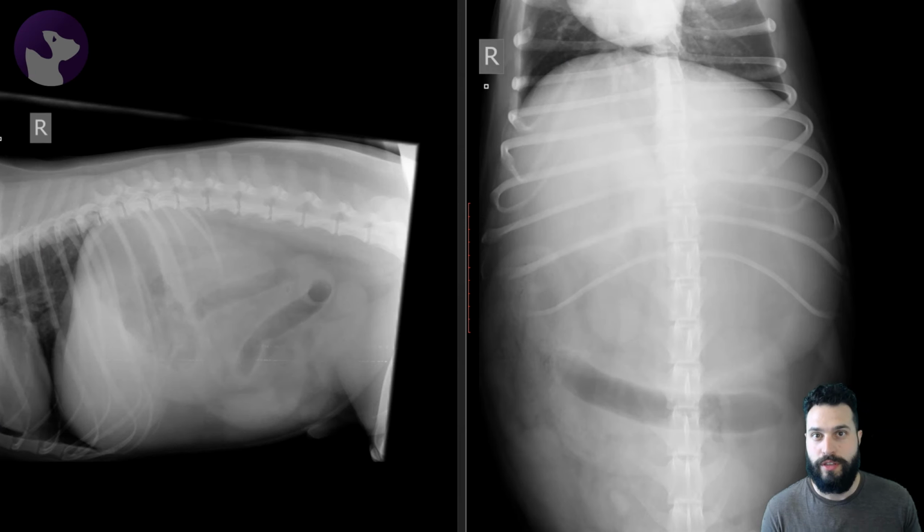There's one thing you're going to come to notice over the course of all these reading room cases: we can never have enough cases of obstruction, and we can never have enough cases of heart failure. Those are things that I think are super important to really hammer home and get into our heads, as common things that we see in the clinic and that we need to be able to evaluate. So let's dig down and take a look at this patient here.